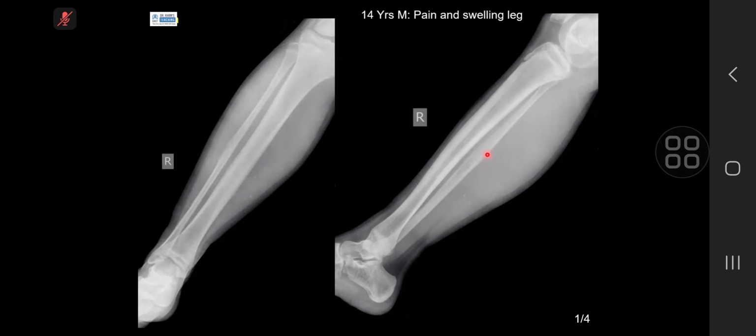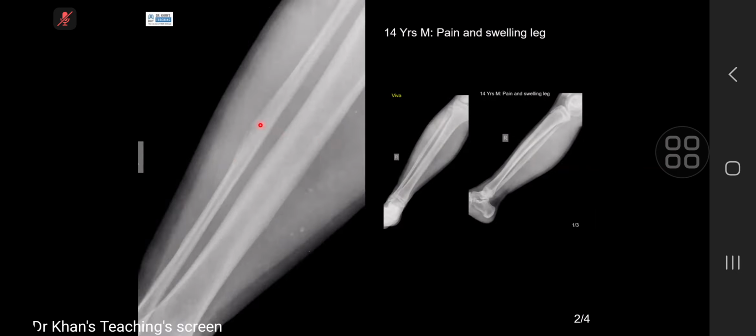This is what we call an intramuscular hemangioma. Now, look carefully at this bone, which is the fibula. The fibula looks like it has permeative bony destruction. This is a close-up. Do you see this here? It looks like permeative bony destruction, and you will say that this is an aggressive tumor. The key point is phleboliths.